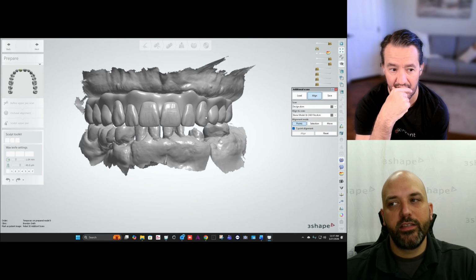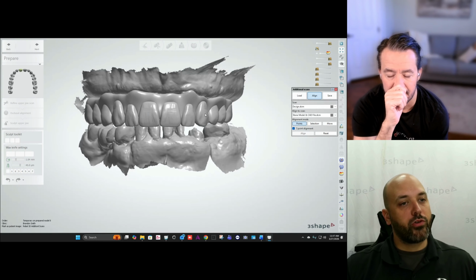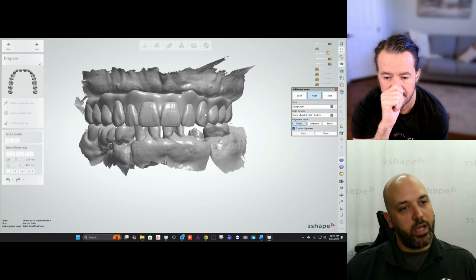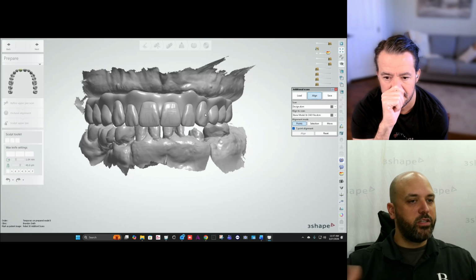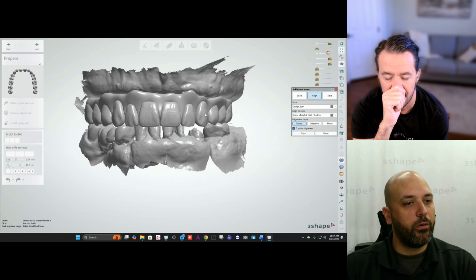And I did this design with the denture module in 3Shape, so you get access to that try-in workflow now. So if I use this as my alignment here to align that CAD file back over, everything will be in the right position. I can adjust the positions of the teeth, readapt the tissue, and I'm done. There's no extra work that I really have to do.